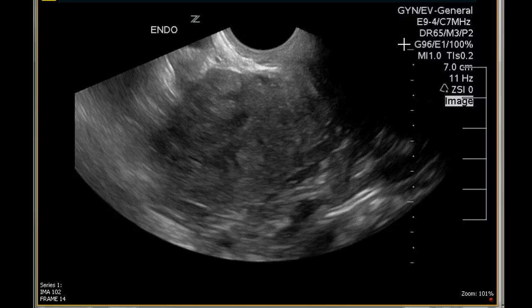She has a known history of endometrial hyperplasia according to the history, so maybe she's been biopsied before. We don't have a comparison. Depending on what the real history is, it's going to depend on what we would want to recommend. But if it's an 8 millimeter endometrium, the patient has a known history of endometrial hyperplasia, so she must have been biopsied in the past, we would probably just leave it up to the doctor at that point and not go into any extensive recommendations since we don't know the history. Which leaves the only thing left, that 1.2 centimeter unilocular anechoic cyst in the ovary.